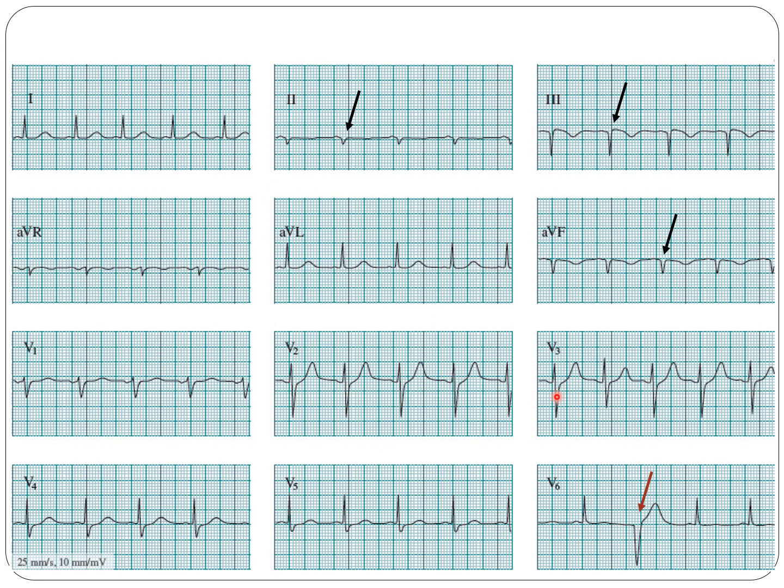Looking at the pathologic condition, first of all, we do see a premature ventricular beat coming almost in the middle of here. And we do have pathologic Q wave in lead number 2, lead number 3, and AVF, and a negative T wave. That can be a sign of an old inferior MI.